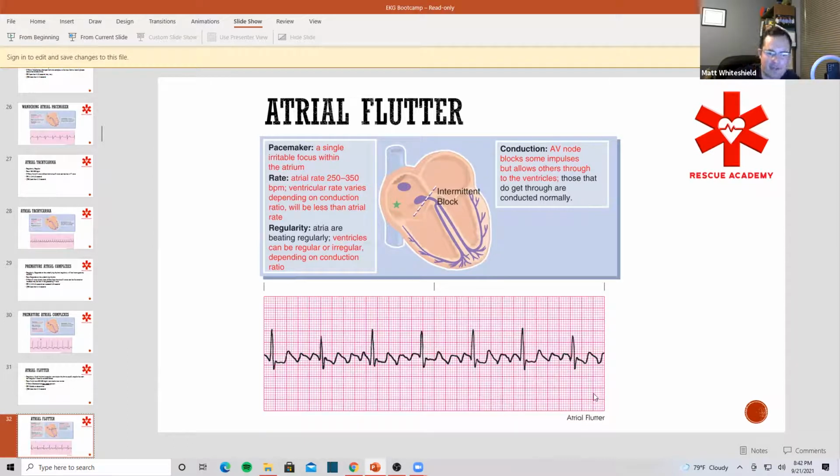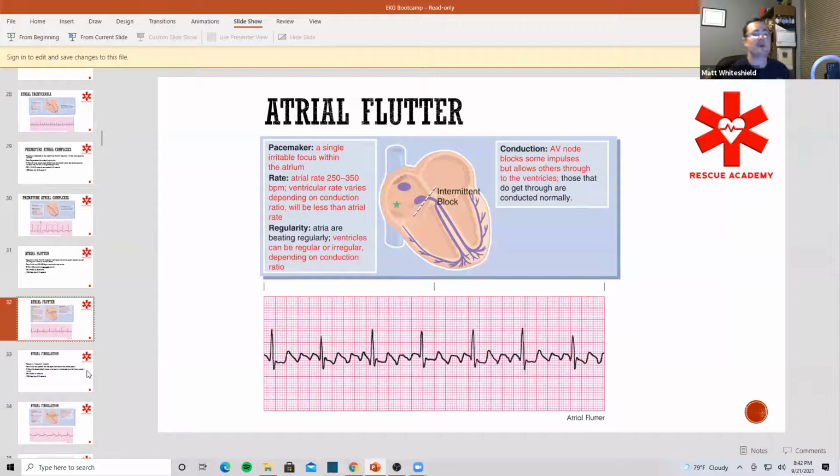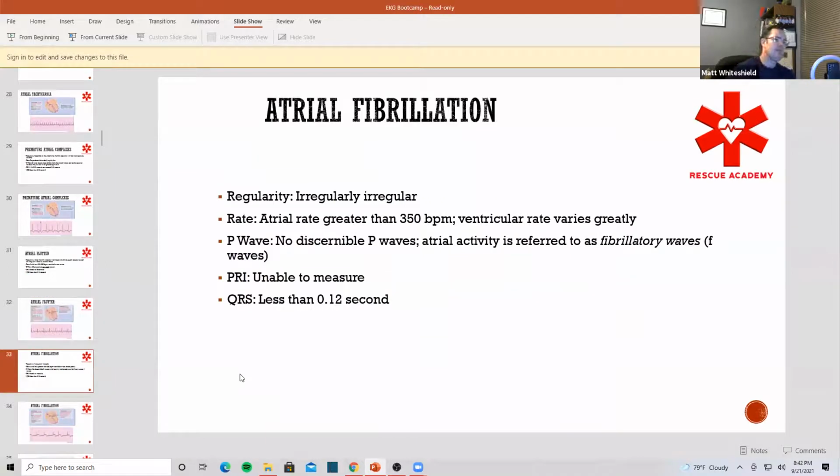Be considered a flutter. Now you can see why a flutter can be so dangerous, because it keeps contracting and trying to squeeze out all that blood. It's contracting so fast that it's not allowing enough blood from the inferior and superior vena cava to fill into that right atrium, right? Because it keeps contracting, so it's not allowing itself to fill. Problematic. And these patients can have a low cardiac output. This is why we've got to slow down that rate, typically with a calcium channel blocker in EMS settings.